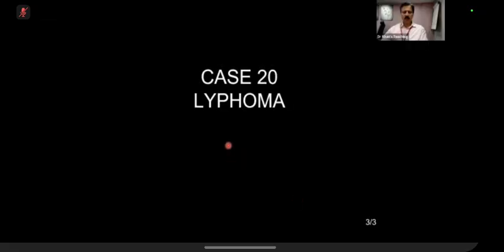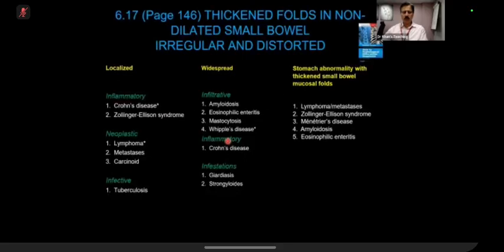Now look at this case. I hope it is projecting for you. Case 20 is projecting. Yeah.